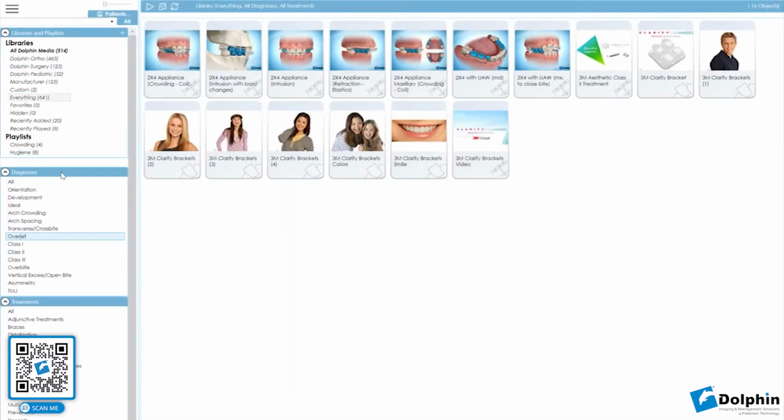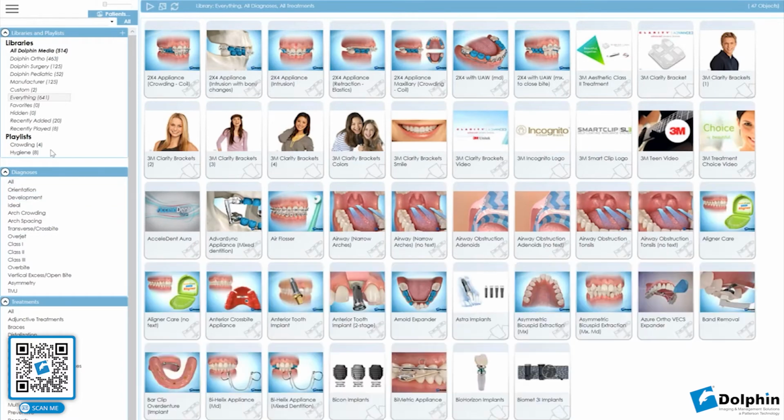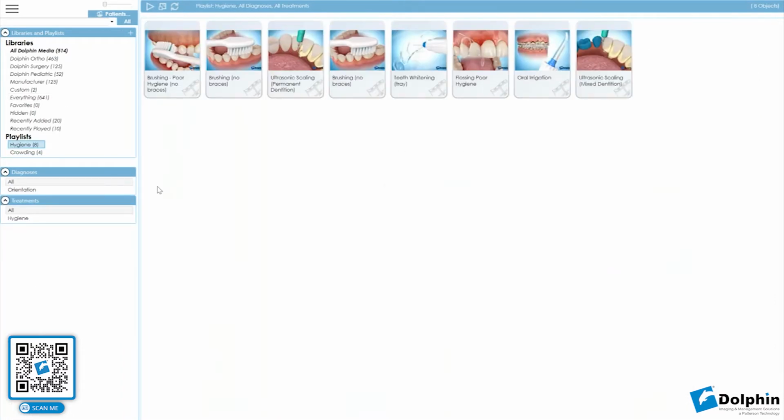Now, even though we have a great content list, the next thing is, well, it's great in your software and it's great in the practice, but what else can I do with Aquarium? How else can I use this to properly educate my patients and maybe even properly market my own practice as well? Well, we do provide export tools as well.